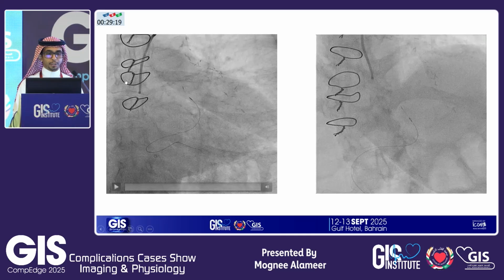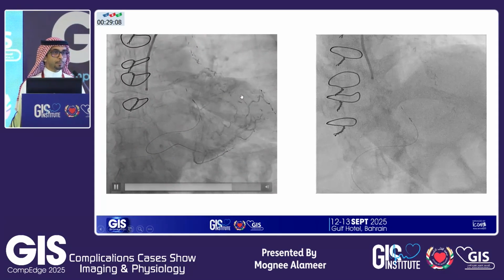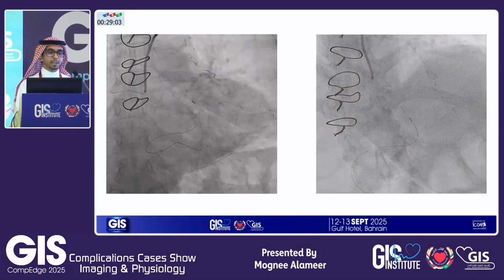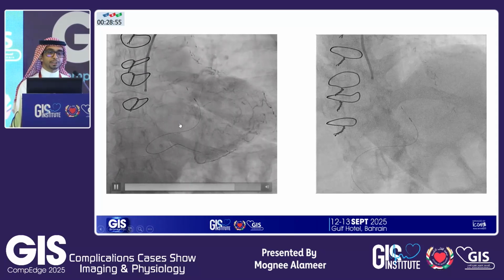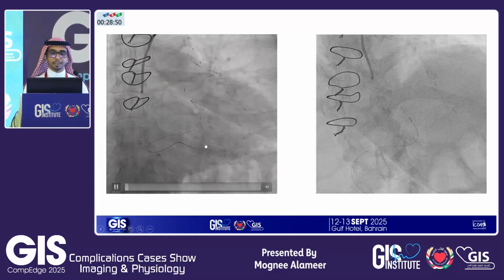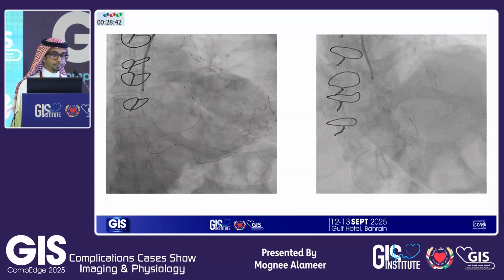He did an angiogram for the patient, and this is the native angio. You can see that the LAD is occluded with a patent LIMA. I didn't bring the LIMA picture, but it was patent. And we have here also an ostial circ tight lesion with calcified nodule, seems to be another lesion here in the mid circ, and also an OM, or if you want to call it PLV, with some flow back into the vein graft. And they documented that the vein graft was occluded to OM.